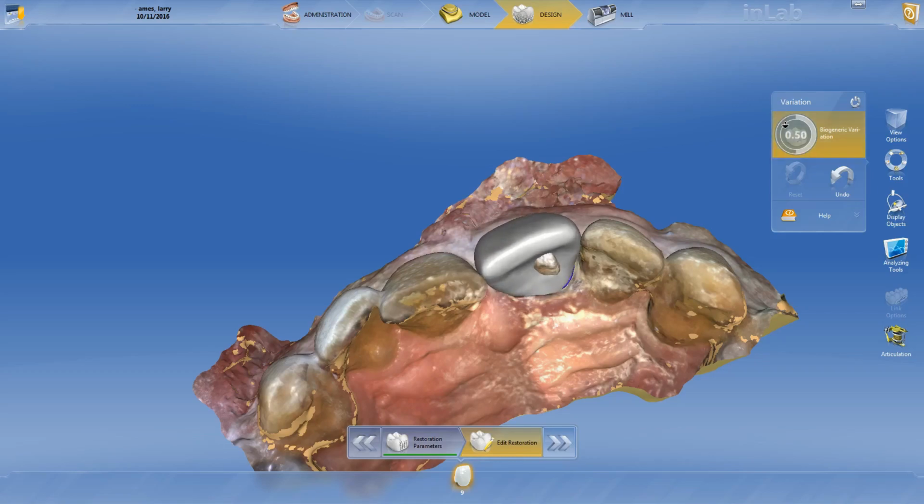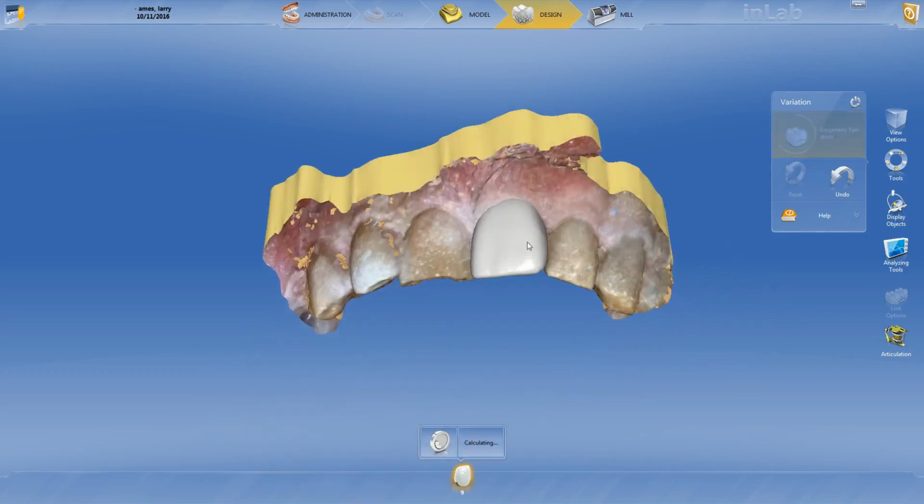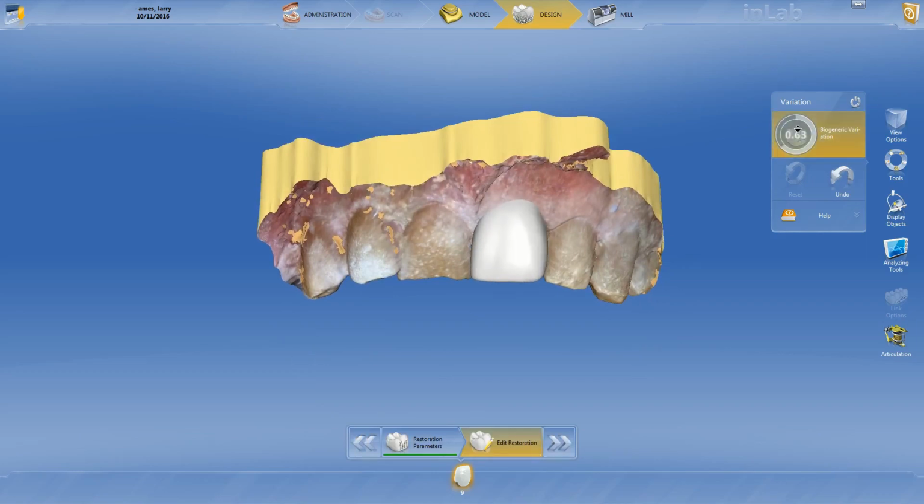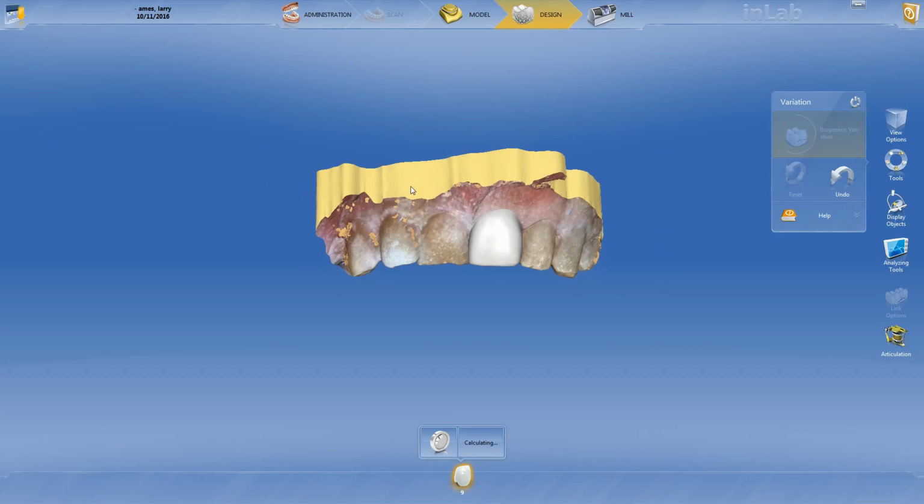So we're in the 50, say 53 range to 66. And that's where we'll look. So I like 58.